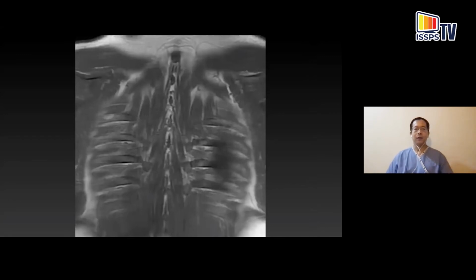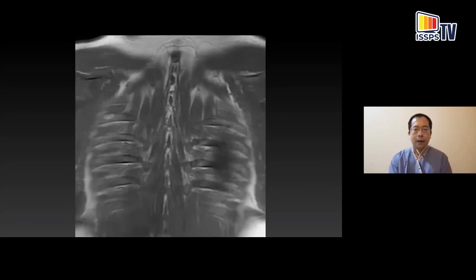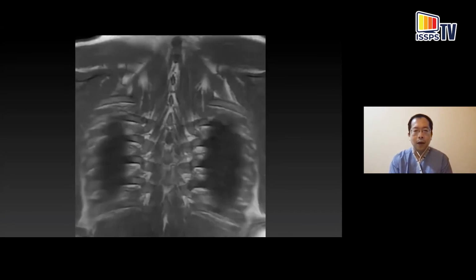Now, this is a useful slide to show the principles that we were talking about. This is your patient, the back facing you, spinous process tips visible here, and the ribs and all the paravertebral musculature and how they are orientated. Remember that in the lumbar spine, the nerve roots tend to emerge obliquely and inferiorly along this kind of direction, like a Christmas tree. But in the thoracic spine, they emerge laterally and horizontally. And we have to be very careful about that. Now, we're coming down along the transverse, the spinous processes go slightly more anteriorly beyond that.